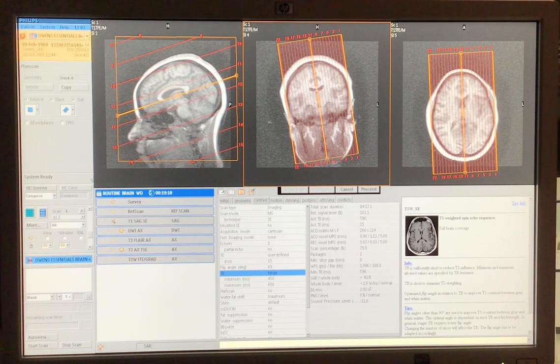So now, what you pick though can be up to you, and it's going to dictate how many slices you have. Because the number of slices that you can get within a given TR is dependent on the length of that TR and the number of slices. Okay? So a TR of 596 is less than 800. A TE of less than 30, we have 15. That's going to give me T1 weighting. Does that make sense?